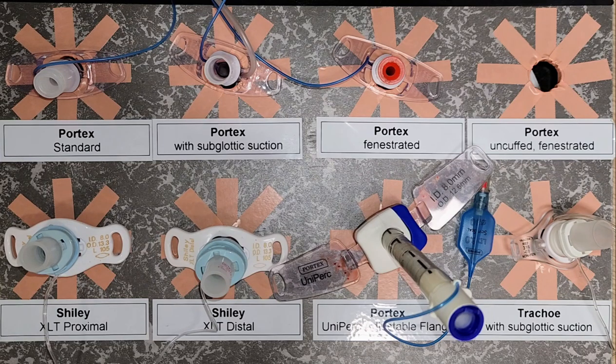In this video, we will go over the different types of tracheostomy tubes currently available in Australia, as well as the many variations that pertain to its effective management. The two most common brands of tracheostomy tubes used in Australia are Portex and Shiley's. Regardless of the branding, the basic anatomy for all brands is the same.